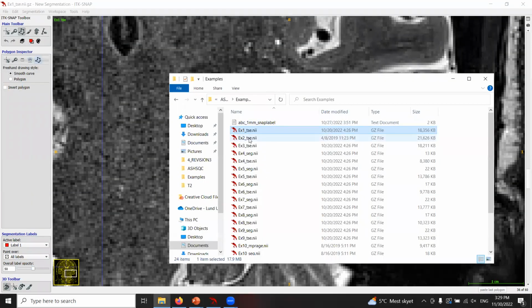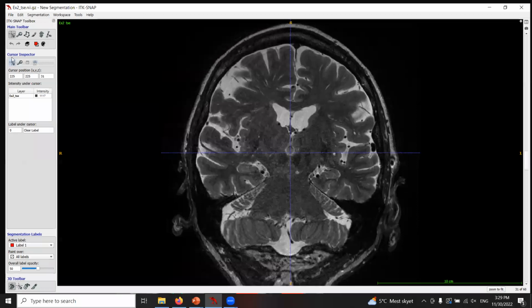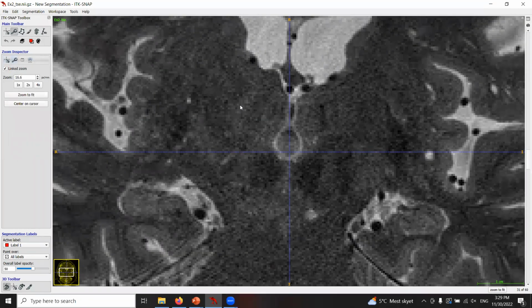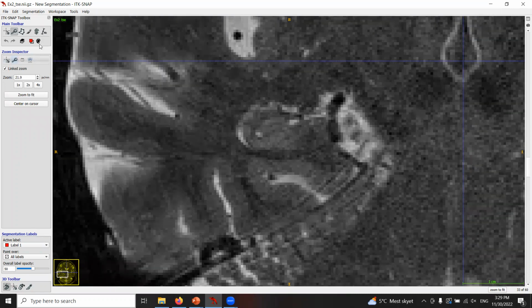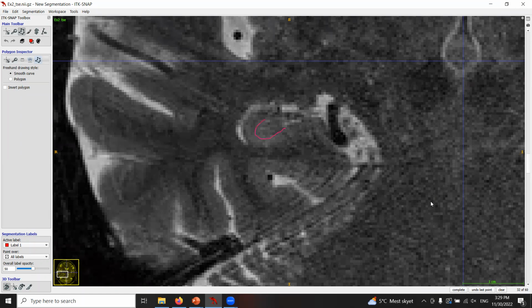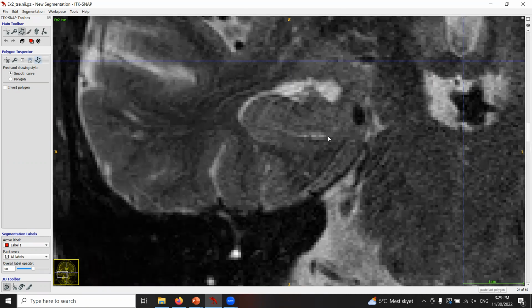So now I will show you another image. So here you can maybe see a bit of noise. And it's a bit harder to see, for example, the dark band in the hippocampus. But for example, this slice, I can see it. So that's okay, I guess. I always like to also go further anterior because there it's often a little bit more fuzzy. But I think I see still most of it. It's not great, but I see most of it.